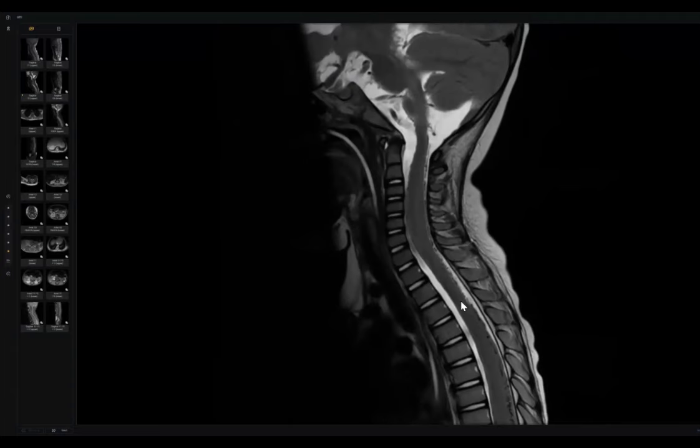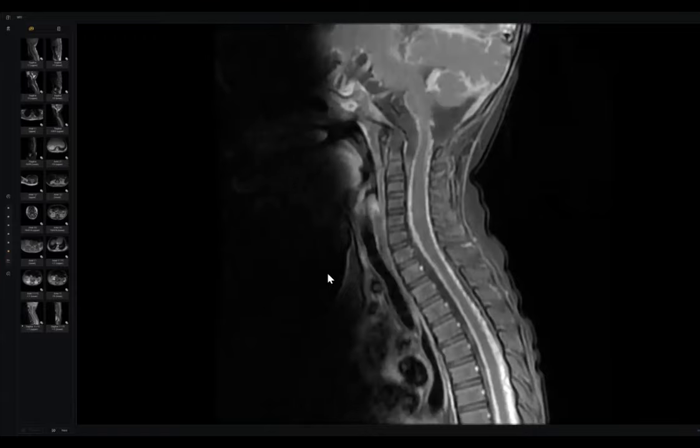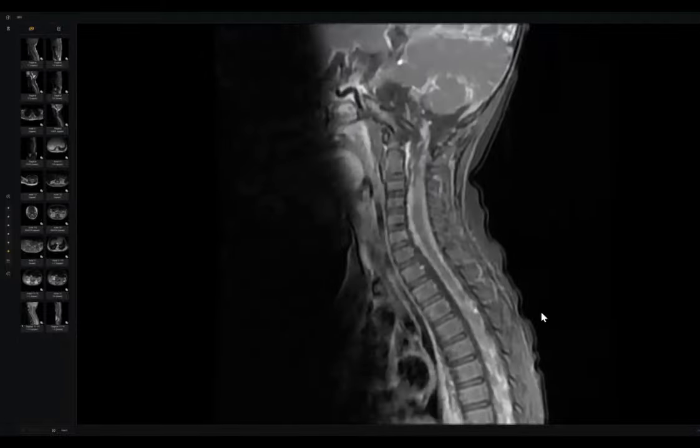And sir, why were the cranial nerves thickened? What happened here, my colleague, is what happens in Viva. I just inverted the case. I started from here, and this is legal. This is my right as an examiner. What happened? Extensive leptomeningeal enhancement. You should look at all the images from up to down. The key for these is the brain images.